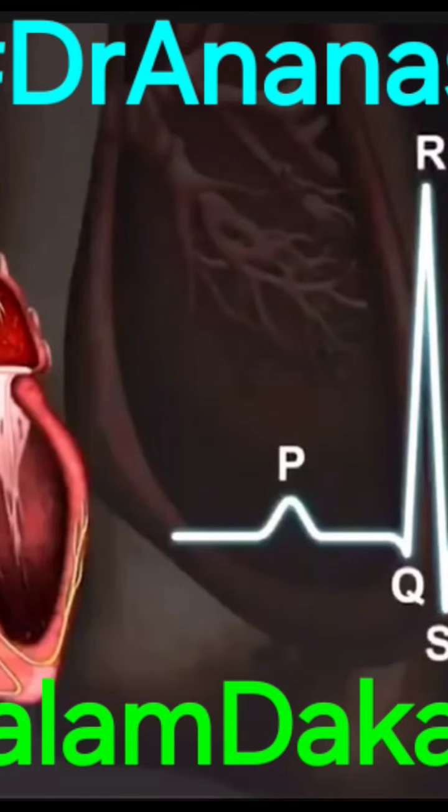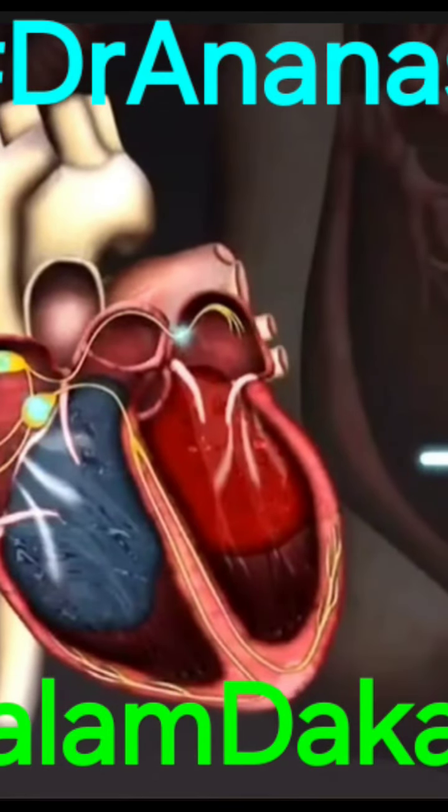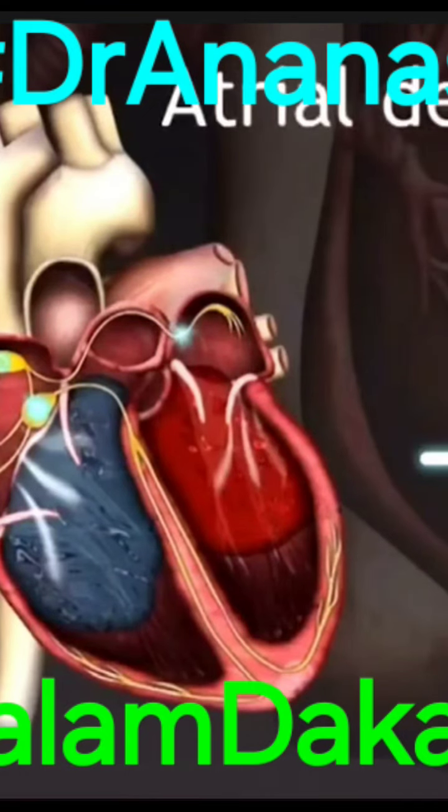How the different ECG waves are produced during a cardiac cycle. The P wave is produced as the electrical impulse travels through the atria, causing them to contract. The P wave corresponds to atrial depolarization.